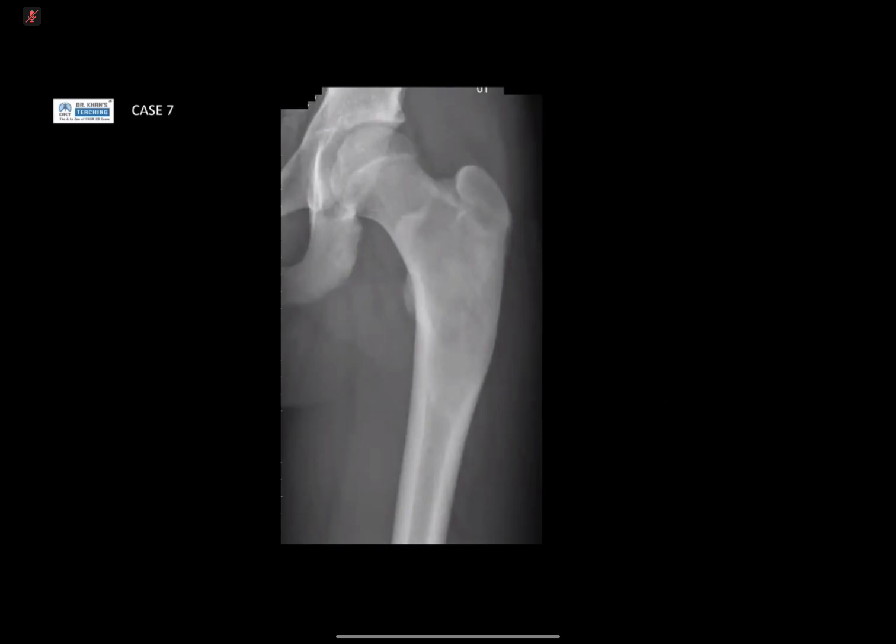Candidate 1, on the same theme. Okay. I see this is a radiograph of the femur. I see there is a wide expansion of the intertrochanteric region and the proximal shaft of the femur. There is a ground glass density of the medullary cavity with expansion.